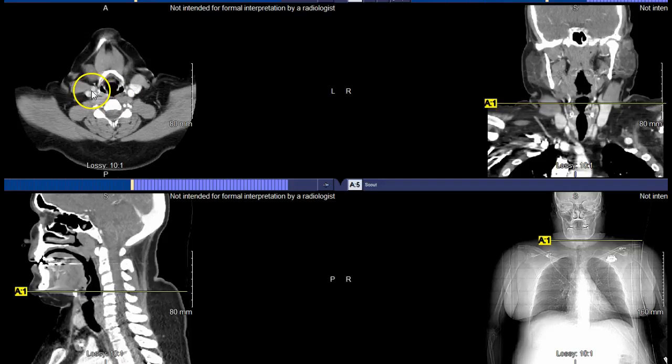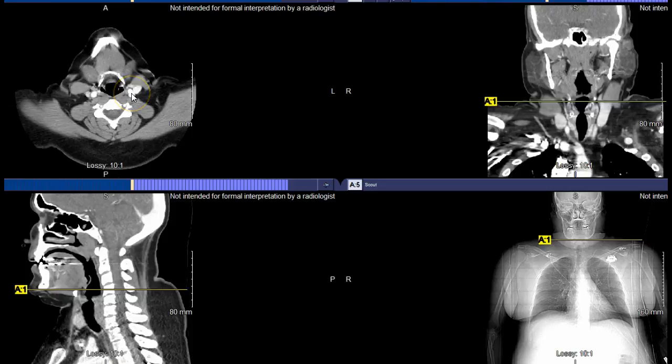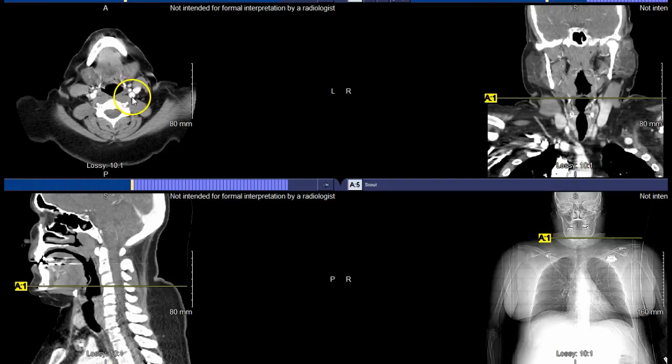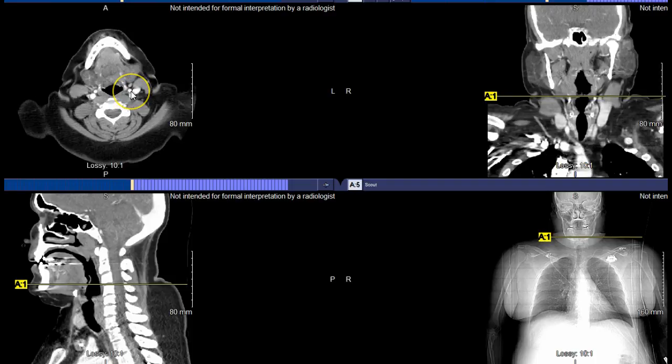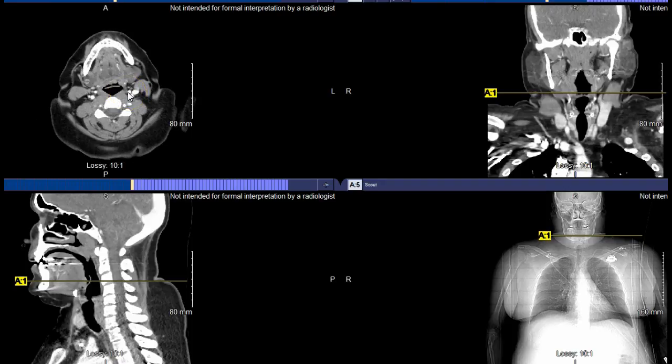You can see there's a bifurcation here, so the jugular is bifurcating there. And then you also can see that bifurcation taking place in the carotids. When we look at that, you can say, all right, now I know this is the internal carotid versus this is the external carotid, just based on those proximities. As we continue to follow it up, I want you to follow the external one and see why it's named what it's named. When it's more medially located, it's really more internally located than the internal carotid.